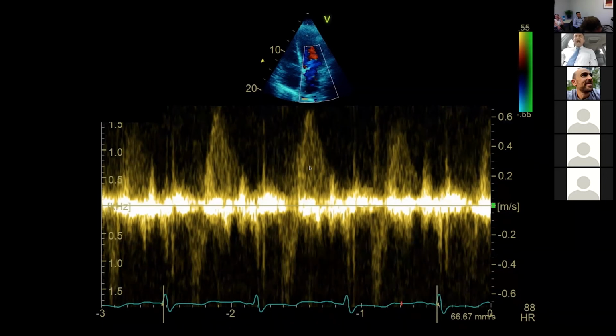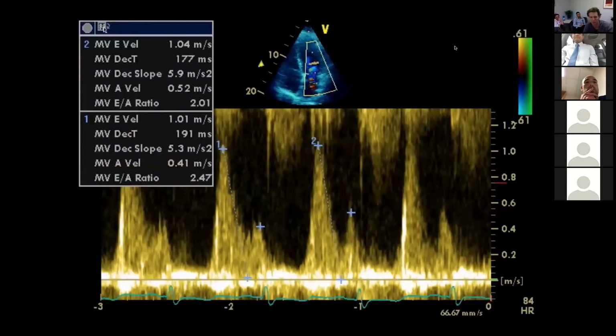So there is more of a diastolic prominence across the pulmonary vein. Nice. So maybe a severe mitral regurgitation. Good man. And raised left atrial pressure. And here we've got systolic flow reversal, I think is what I was trying to demonstrate in this. Yeah, okay. But again, it's not the best one.